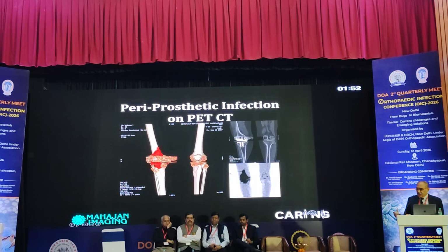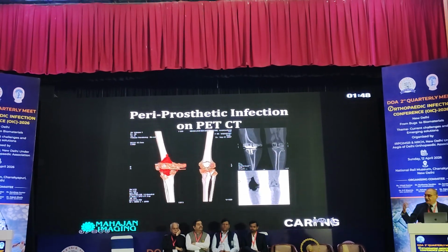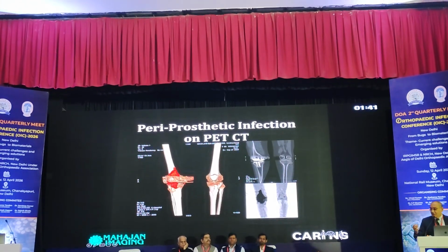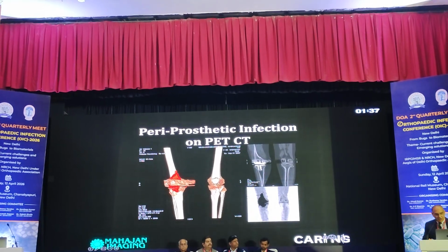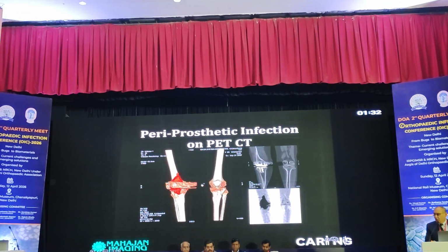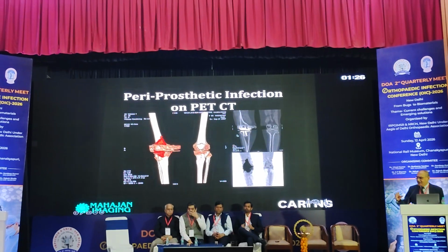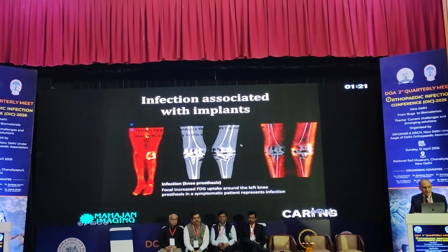Apart from MR, we of course also have, we used to do in the past, WBC labeled bone scan, which now has been discontinued. The material is no longer available since it was biological, and it has been discontinued across the world. And what we use now is PET-CT, which can also show you infection very, very well. As in this case, the advantage of a PET-CT is that CT is also part of that examination.